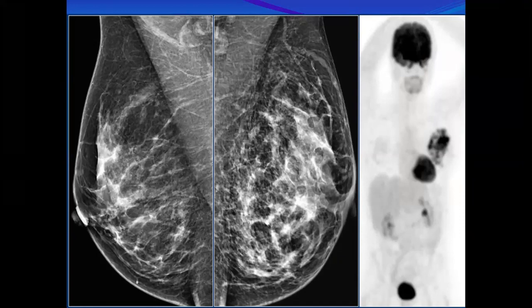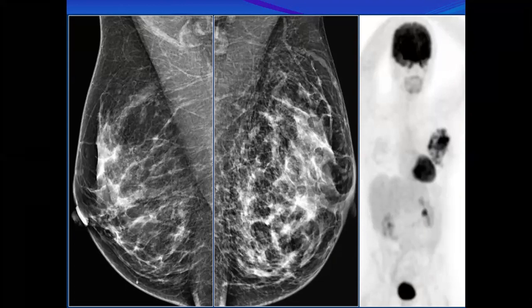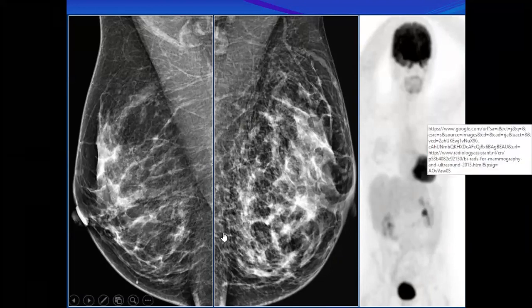Any suggestion? Do you agree? I think the smaller one, I disagree. The smaller one is usually more suspicious, because usually in inflammatory carcinoma the patient presents with a smaller breast. Yes, there is infiltration of the lymphatics of the overall breast, with shrinking of the size of the breast. This infiltration of lymphatics causes the trabeculations and the prepectoral edema. This area is rich in lymphatics, giving this edema here.